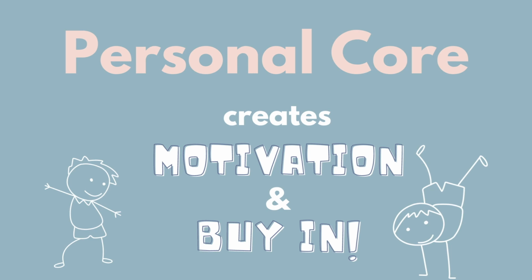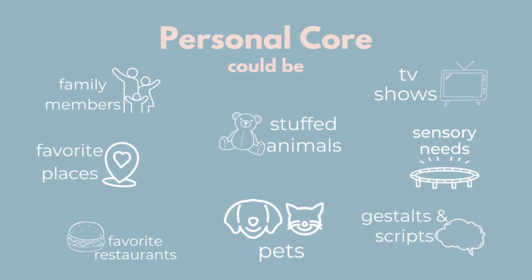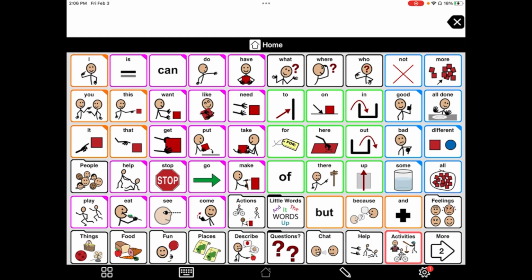Personal core can include things like family members and favorite people, favorite restaurants or places, names of pets or stuffed animals, or common phrases that your child or family uses. We want the device to be the child's voice, and every voice is different. So we want the device to reflect that. So today I'm going to show you how to edit a button in the device so you can add those personal words.